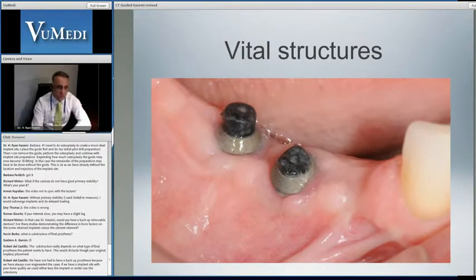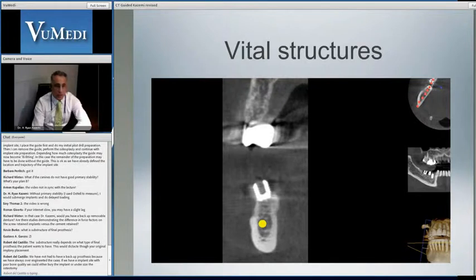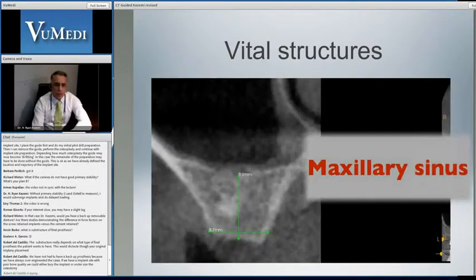The surface was exposed, and as the cross-section shows, they were in poor alignment. And we have plenty of bone from the canal indicated by the yellow area and the crestal bone, so there's no reason not to take advantage of it. And here's the second implant. Ultimately, these implants had to be removed. The site had to be grafted and prepared for a new implant.